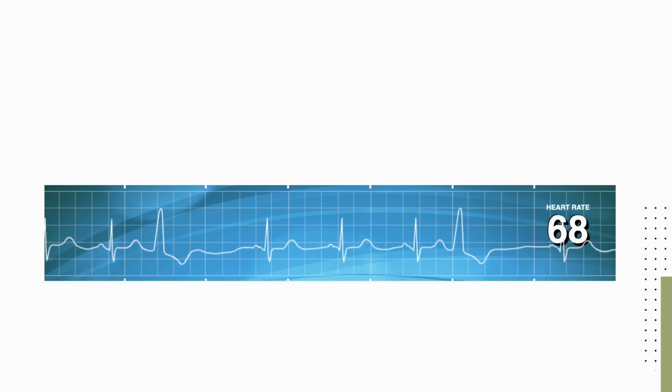Our final and very common form of aberrancy, or premature complex, is in our final area of the heart, the third area, the ventricular area. By definition, which is hilarious to me, a premature ventricular contraction is wide and bizarre. If you were to pick out the wide and bizarre looking one, it's pretty obvious. So this would be a sinus rhythm with premature ventricular contractions, or PVCs.